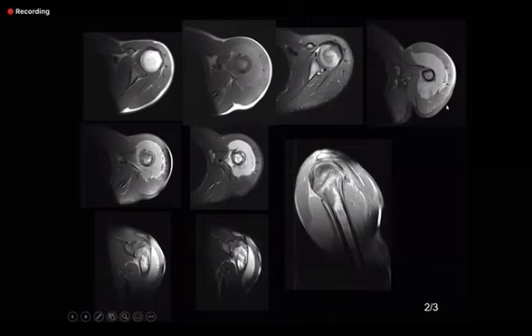So I can see a large soft tissue component surrounding the left humerus. The lesion is iso-intense to muscle on T1 and demonstrates significant soft tissue enhancement. I can also see a medullary-based lesion, which is of heterogeneous signal. Putting this all together, it will be in keeping with Ewing sarcoma.